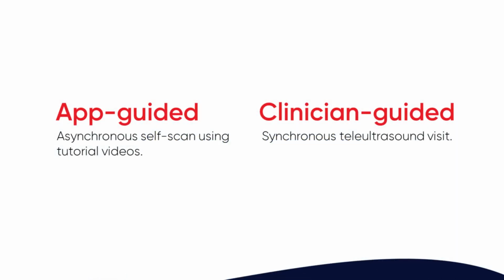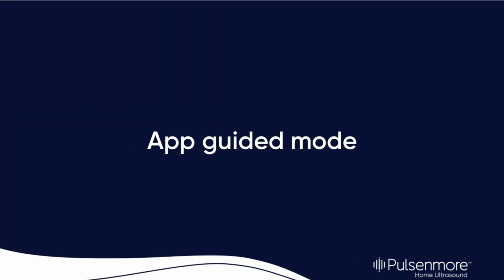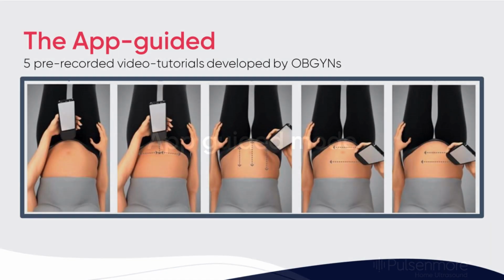The Pulsenmore solution offers 2 modes of operation: the app-guided asynchronous mode and the clinician-guided synchronous mode. In the app-guided mode, patients are guided through video tutorials to create 5 ultrasound video scans. These tutorials are based on scanning protocols developed by OB/GYNs for remote prenatal ultrasounds.